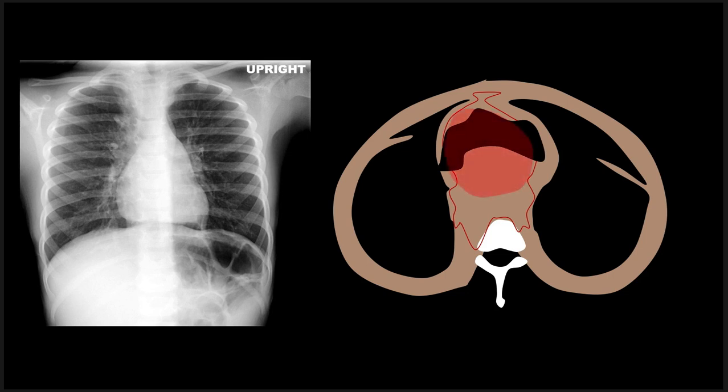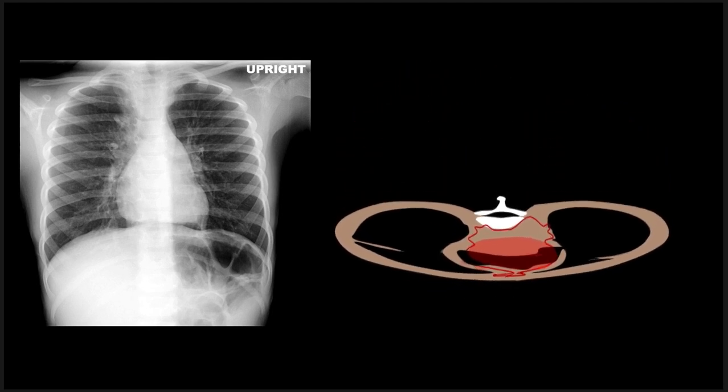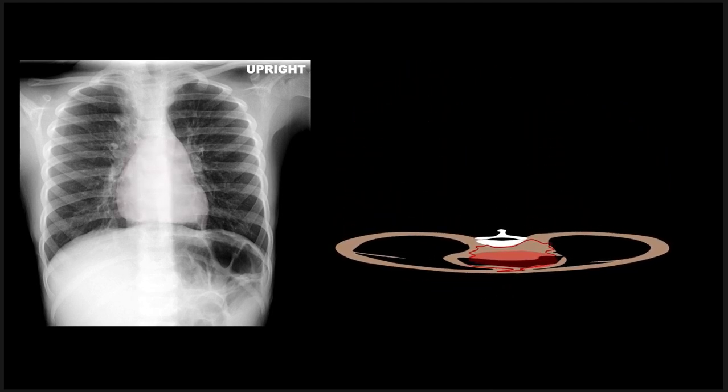Now let's flip this around and make this 3D for you. Think three-dimensionally. Imagine that here's the patient's heart. Bring that over here. Now take a look at the base of the heart on the radiograph, here and here. There's air there, right? That air should not be there. There can only be air under the heart if there is mediastinal gas.